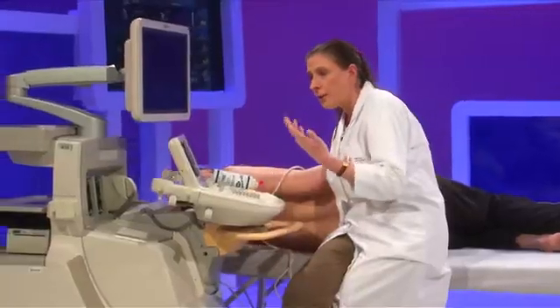So we saw the confirmation of the diagnosis using multiple views; be very careful when you use the four-chamber view because of this problem of dropout. It's important to assess the severity of the shunt. It's also important to look at the repercussions, right atrial dilatation, right ventricular dilatation, and also if you envisage a percutaneous closure, you can already have an assessment of whether it's possible or not.